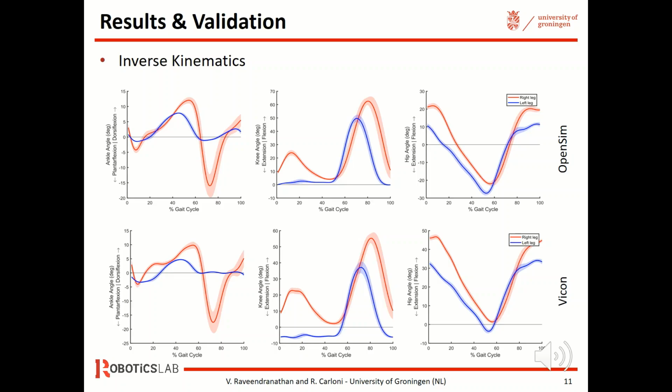It can also be observed that around 70% of the gait cycle there is an active plantar flexion of the right ankle, whereas the prosthetic ankle fails to do so. Similarly, for the knee angle, the intact limb shows the compliance of an active flexion during the heel strike, whereas the prosthetic knee shows an active damping.